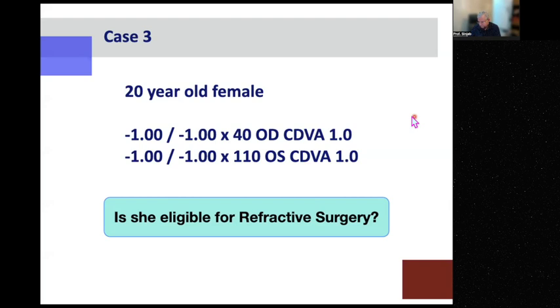So in this case, you would not do a cornea-based refractive surgery. No, of course, I respect your experience as well, Dr. Mahanna. But I mean we don't want to go beyond the norm. To be safe is better. In this presentation we are dealing with mostly residents, so we don't want to talk about out-of-the-box cases. So yes, better not to do a corneal based procedure for these type of patients.